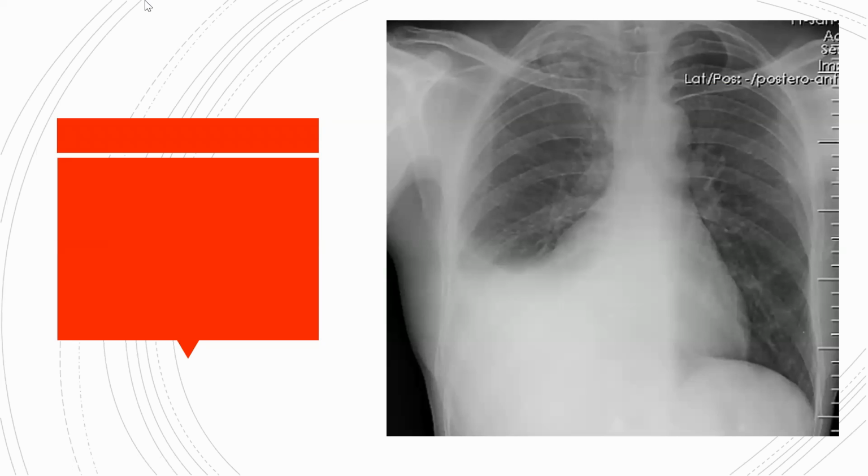Yeah, keep those answers going, guys. A few more seconds. And when you're looking at these chest X-rays, I want you guys to also remember about everything else. Obviously there's this white thing here that you're like, oh no, what's going on? But don't forget to check everything else, right? Like, check the heart, does it look okay?